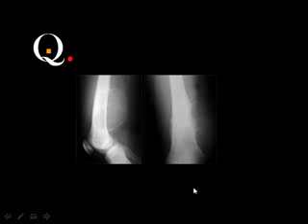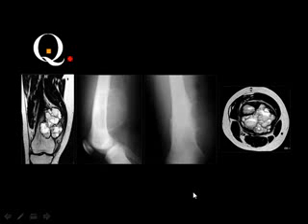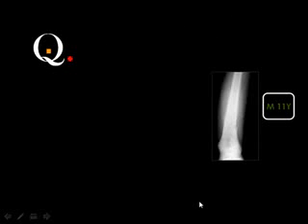Osteosarcoma. Then look to the MRI of the same case. Yes, aneurysmal bone cyst. This is an expanding lesion, and it has been proved to be an aneurysmal bone cyst. Yes. This is an unusual appearance of the aneurysmal bone cyst. This is a male patient, 11 years old.